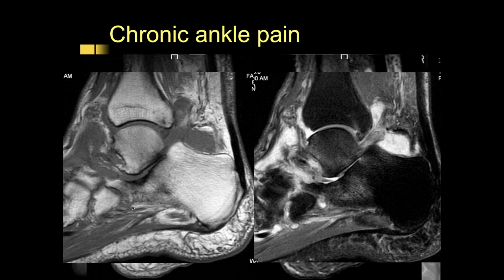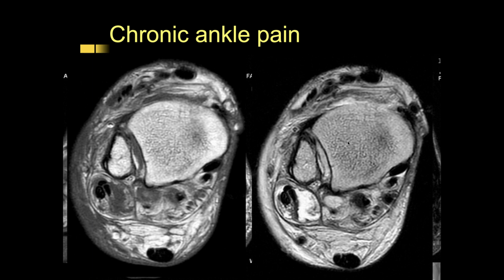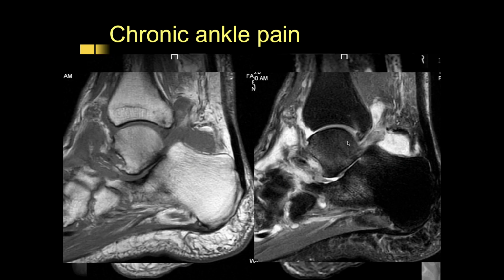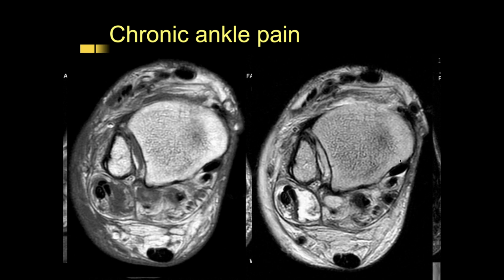Okay, here are some other images of the same patient. So what we're seeing here is edema and eburnation in that lateral talar process. And now you're also showing that there are large effusions or synovitis. Right. Yeah, big effusions. The head is missing, isn't it? The what? The head of the... I think it's just the angulation and location of the cut, John. But that's a good point. But I think that was just it.